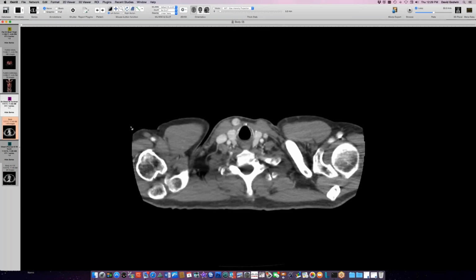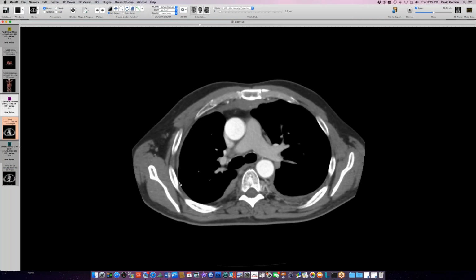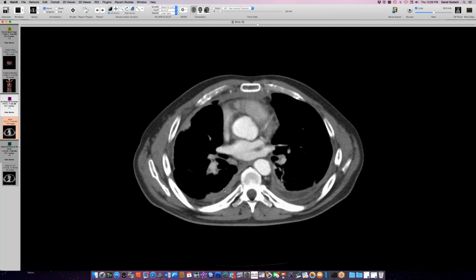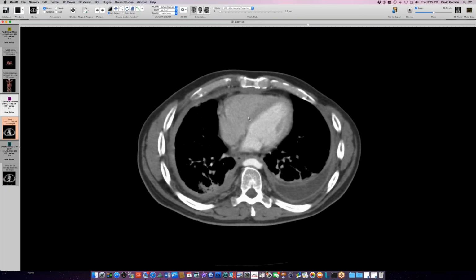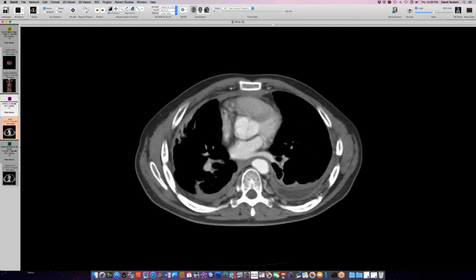And then fast forward 7 years to 2017, and we still have a pleural process here on the right, a little bit more pleural thickening posteriorly than before. Now we have this anterior mediastinal process here with this big band of tissue that shouldn't be there. Plus we have left pleural process here with some loculated sort of trapped effusion there, some pleural thickening, visceral and parietal.